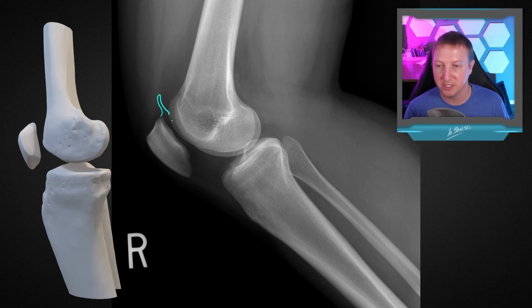This is a nice lateral, and we can see that this is collapsed down here. All right, and so the tibial tuberosity is where our patellar tendon or ligament attaches, and so you can see that kind of bumps out here to give us this nice surface to attach onto, and then the other end of it is at the patellar apex down here, and then the top of the patella is actually called a base. Some people will call this the superior and inferior pole of patella, but technically it's the apex and the base. And so the patellar articular surface runs from here to here, and the portion down here is non-articular.